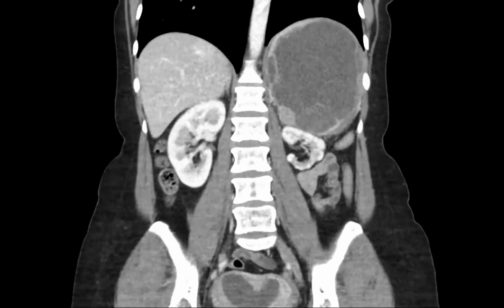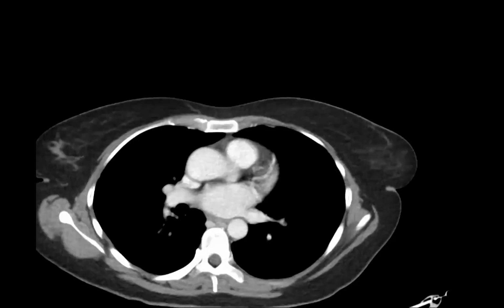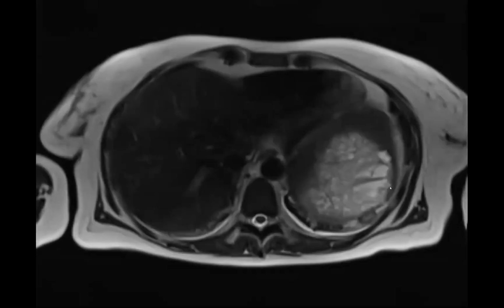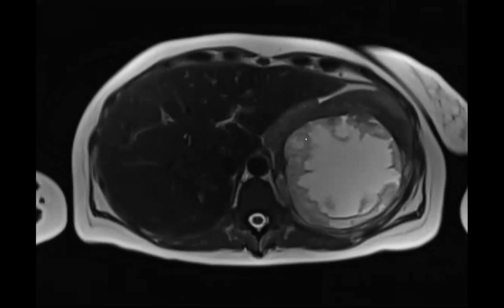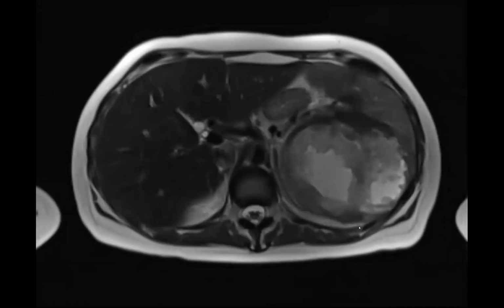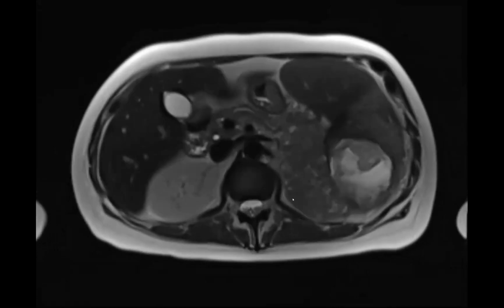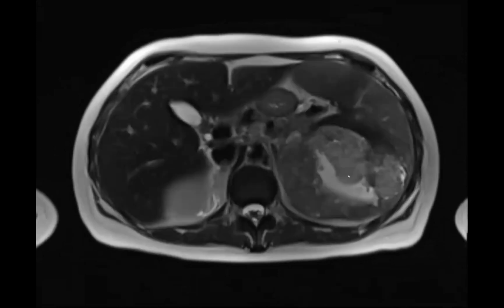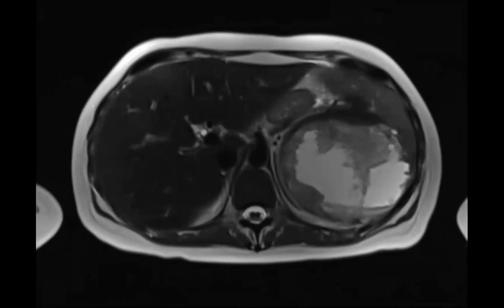Anyway, time went on. We said it was a splenic abscess. It had this stuff growing out of it, and then eventually they came back. And I'll say this, all this stuff was not enhancing. So this was still that part that we thought was originally the abscess. And then suddenly there was this large, new, gray T2 intermediate component, this large mass that showed up here. And I'll show you the post contrasts.